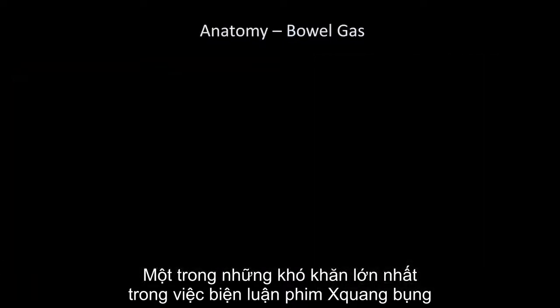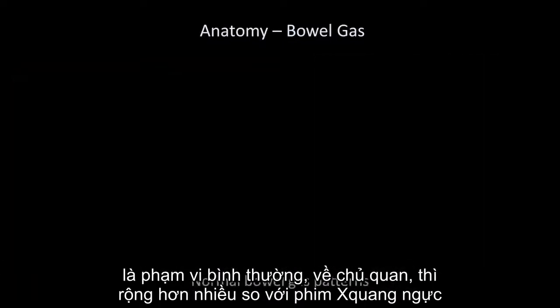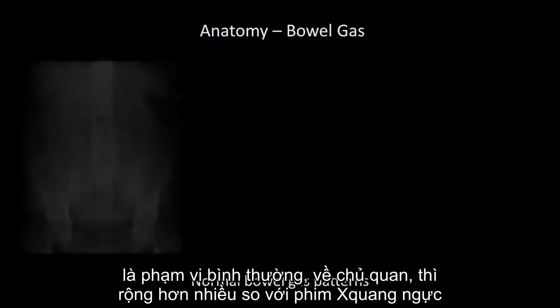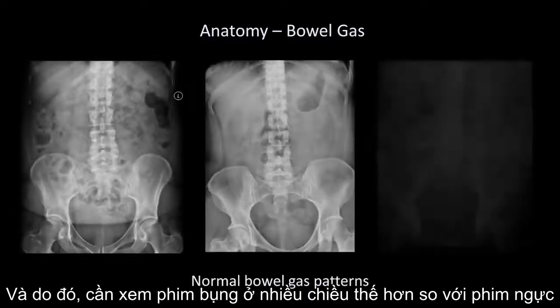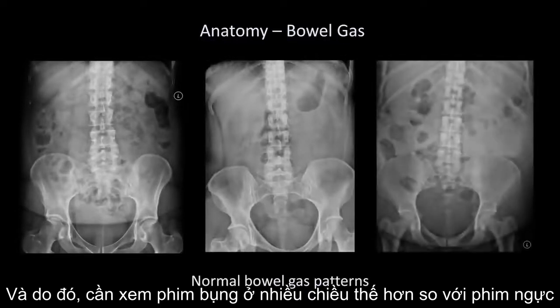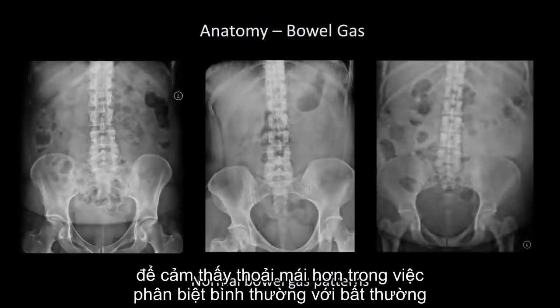One of the most challenging things about the interpretation of abdominal films is that the range of normal is subjectively much wider than it is for chest films, and therefore it takes viewing many more abdominal films than chest films to feel comfortable in distinguishing normal from abnormal.